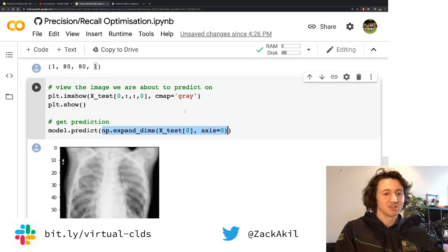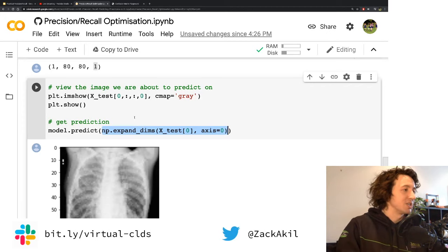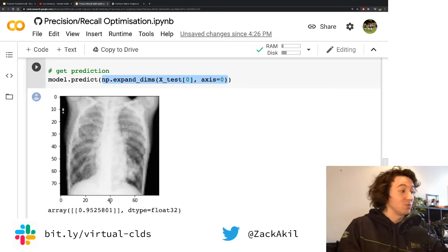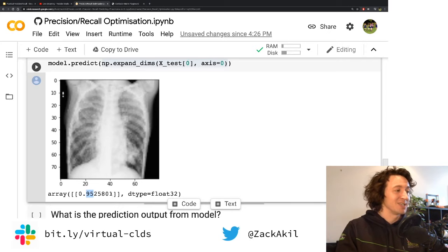All right, we got a question there about 64 versus 32 on the convolutional layer. Yeah, that's the neural network thing. We can discuss that at the end. But when we make a prediction with this, what's the output? Well, oh, it's actually very close to 1. Again, not 1, not 0. It is a number between 1 and 0 by default.